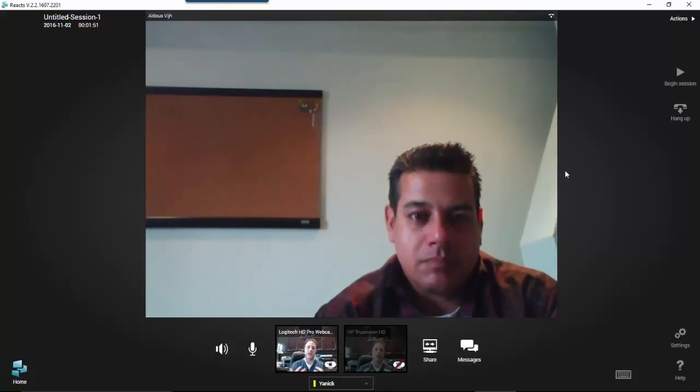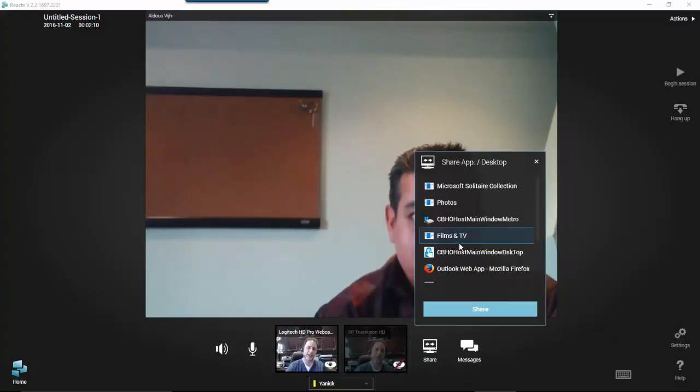So here, Aldous and I were in the face-to-face mode. So he sees me, I see him. From that simple screen, we can use the secure messaging as I showed you. And if I would like to share a PowerPoint with him or my browser or anything else, I would just hit here the function share. And this shows me everything that's open on my computer.